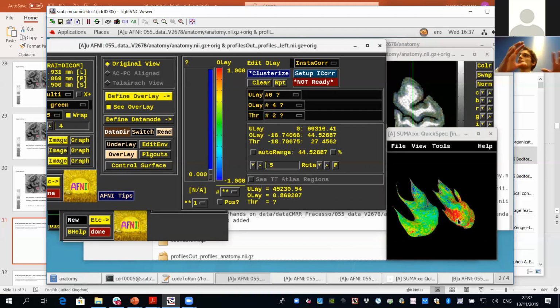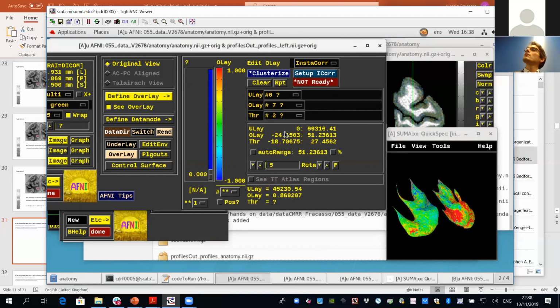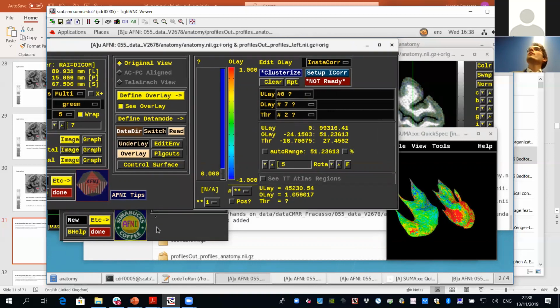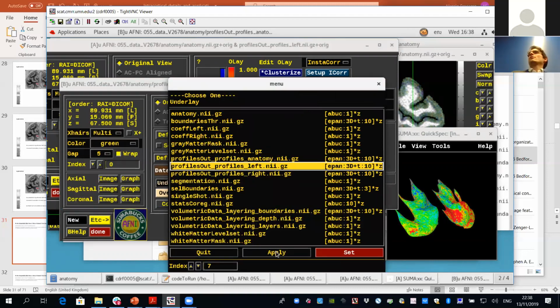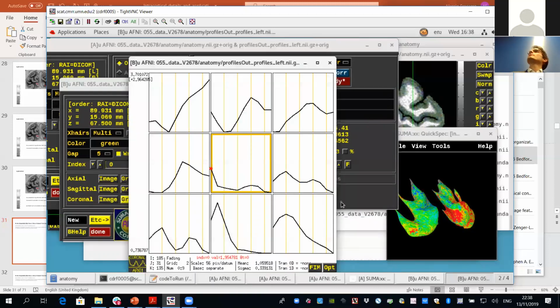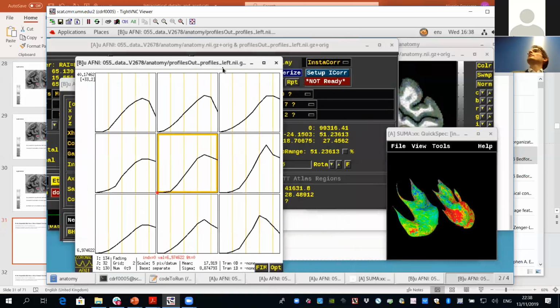And then we see that the activity is a little bit more spread around the surface. And then towards the pial surface, it gets even higher, right? So this is on the surface level. Then you can see the same thing at the single profile level, the same way I derived the profiles yesterday that I showed you. Then we can go somewhere in the middle, where there is actually activity.